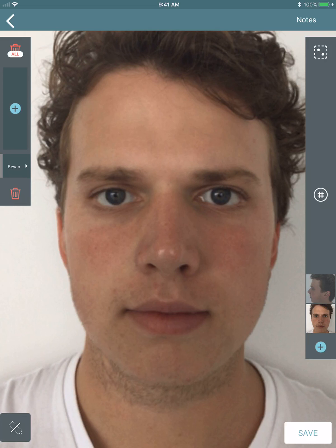In the previous video, we looked at how to take multiple photos of a patient in the filler injection screen. This is going to be important for this video where we review the point pool. First, I'm going to log 2 injection points on the face of the patient.